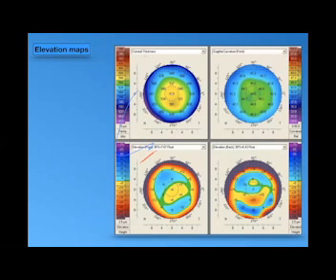The best fit sphere is the common map used for all, but in case of high astigmatism, if we have any abnormal maps, either the curvature map, which is the topography, or the elevation, we put it on the ellipsoid fit sphere.